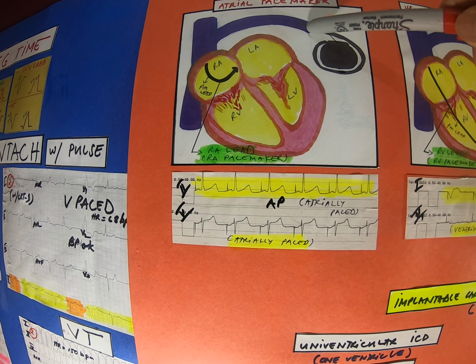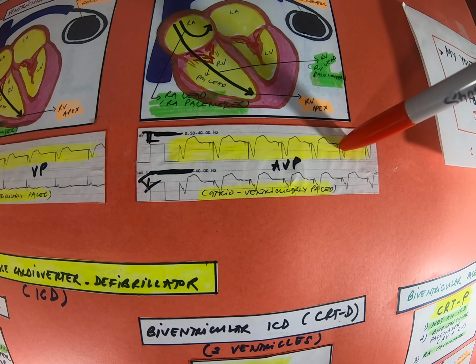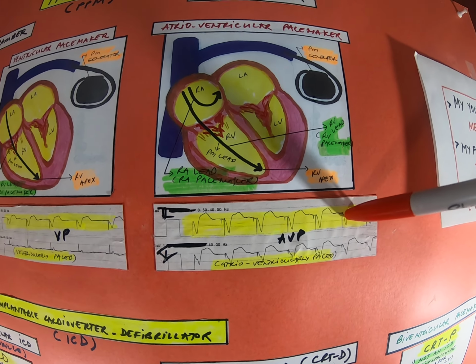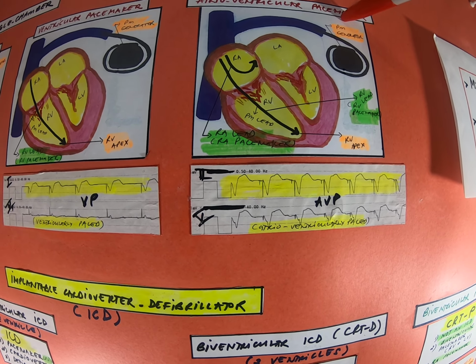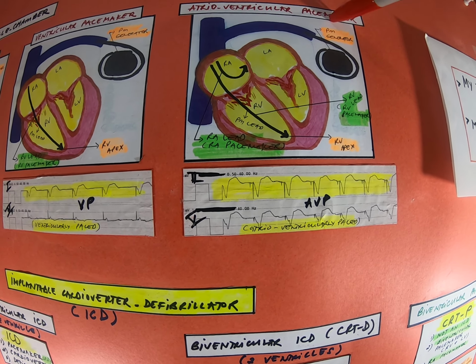Normally this dual chamber or atrioventricular pacemaker is used for sick sinus syndrome, pauses, but we have those sinus beats and we want to keep the atrial kick. If you look at this ECG strip, we have an atrial spike and a ventricular spike, and they are captured. There's a good capture. Good spike, good capture follows good contraction. We check the blood pressure and everything, and the patient is okay. So we have an atrioventricularly paced rhythm. That is used mainly for sick sinus syndrome or tachy-brady syndrome, or those with pauses but still not losing the sinus beats, but we want to keep the atrial kick.